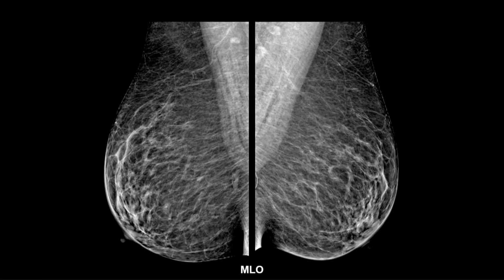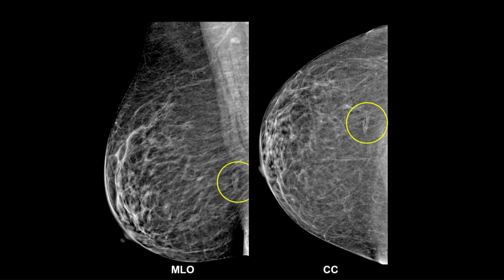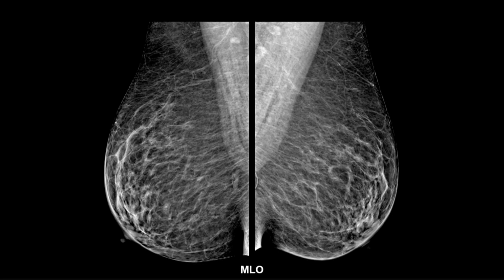Okay, she's asymptomatic, case 18. And here, this is an interesting case. Not a particularly worrisome case, but an interesting and instructive case. By the way, take note, just briefly, you see this little line here?